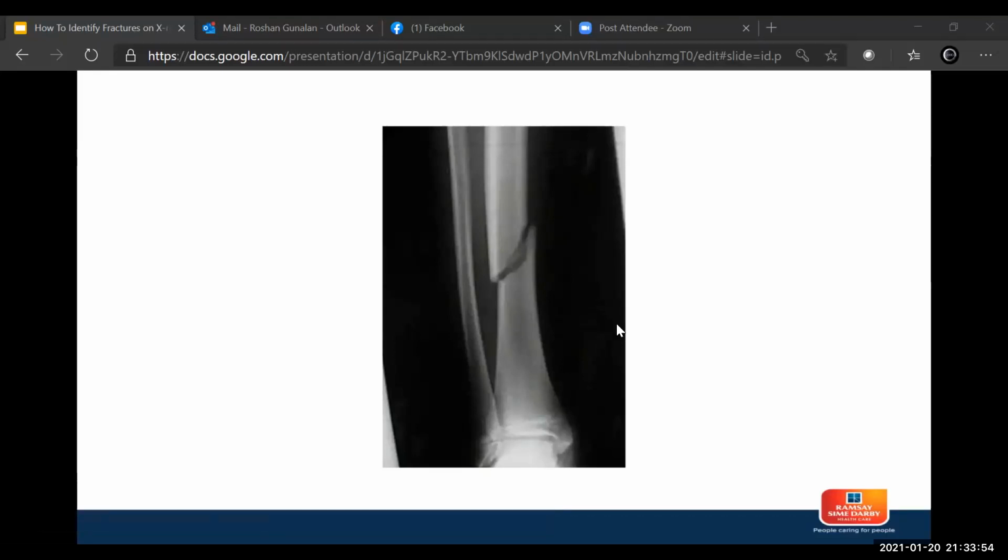Okay, so the point I'm making is, if you look at this X-ray, again, we go step by step. Again, patient's name, date, whatever. This is a fracture of the tibia. We're not even sure left or right because it's not labeled there. So this is probably the right side. Assume it's the right. Inadequate because there's only an AP view, there's no lateral view, and we can't really visualize the knee joint. But there's an obvious spiral fracture at the distal third or mid shaft of the distal third of the tibia.